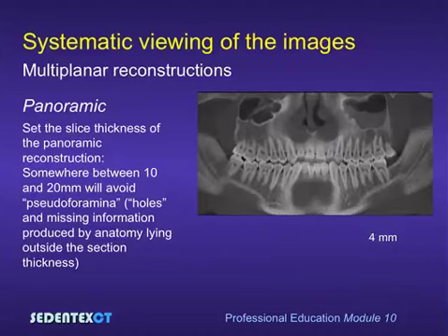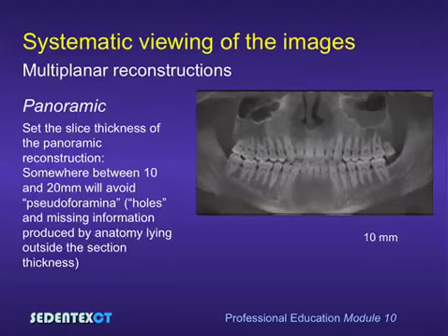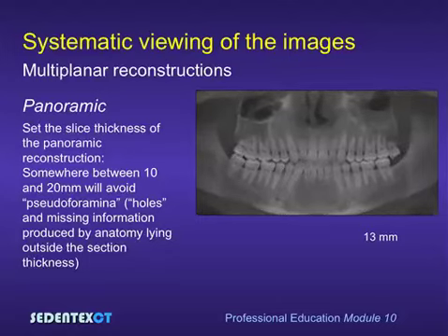By increasing the thickness, we can see that we're gradually producing an image which is more classically like a panoramic radiograph, and provides more useful anatomical information.